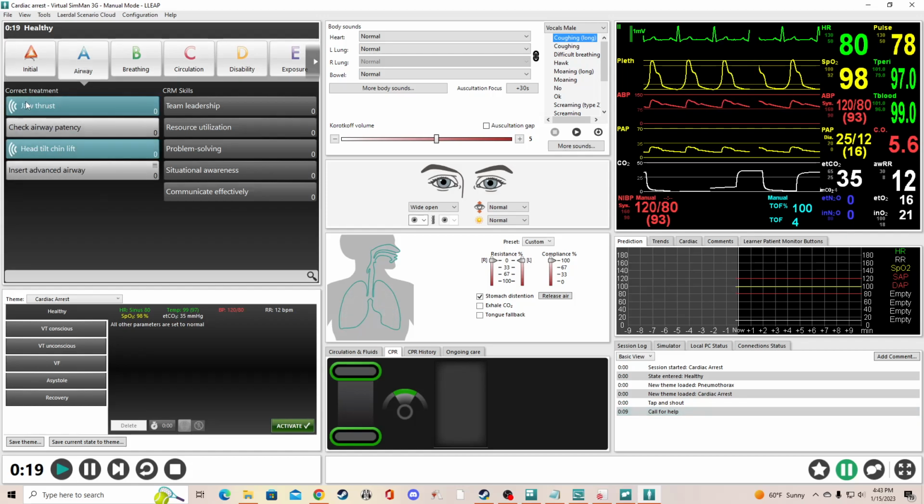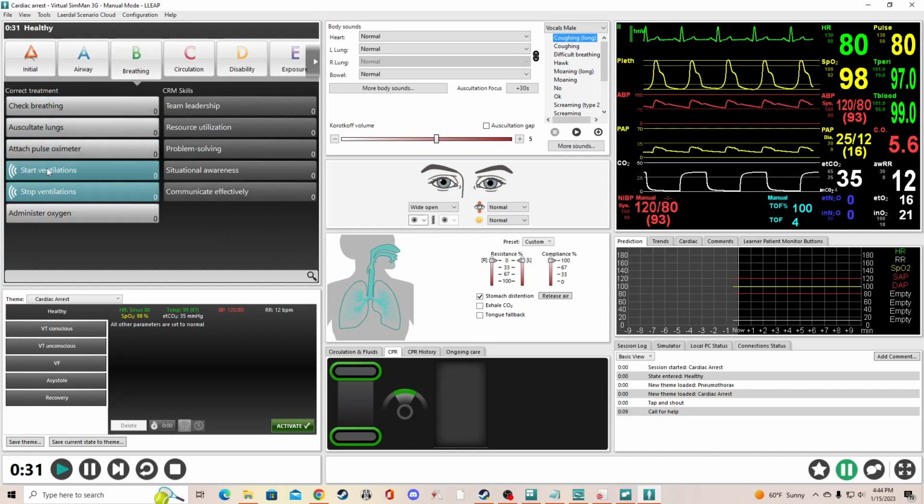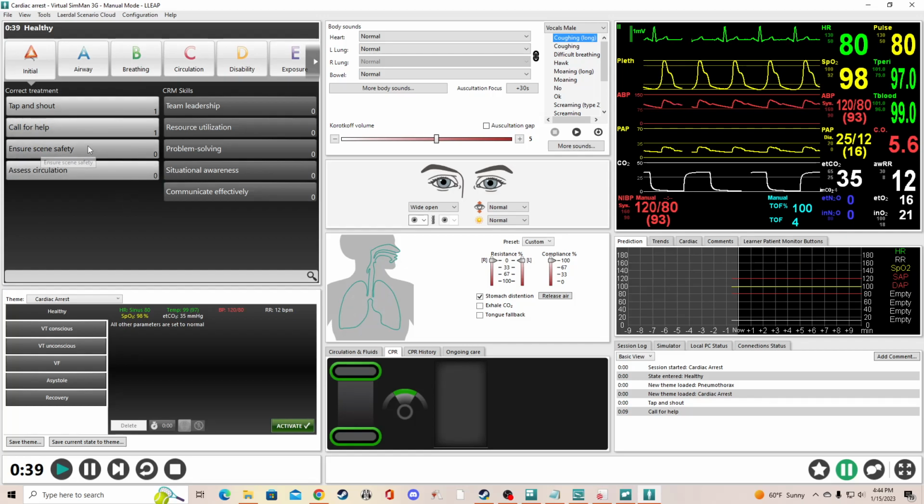take notes. These blue buttons with the waves next to them should have actions on them, but I have not been able to see the actions actually automatically happen. And then some of these things we'll actually do is you can assign actions to this, so you can actually run a whole scenario through here, which I've done before too.